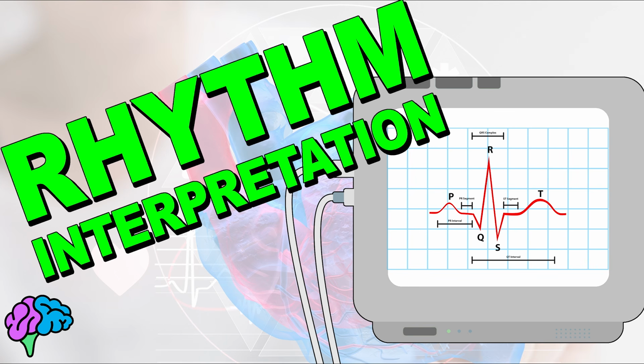Alright everyone, this lesson here is going to be the complete ECG Rhythm Interpretation series, all in one video. All 6 lessons from that series are here back to back, and we'll cover everything you need to know about rhythm interpretation, from the basics on the conduction system, steps to interpretation, and the various rhythms, arrhythmias, and blocks that are essential for you to know.